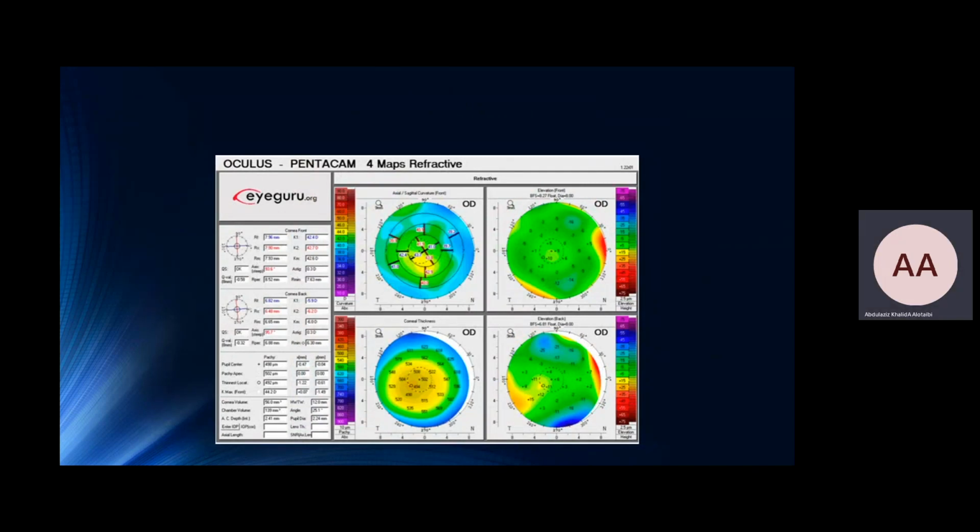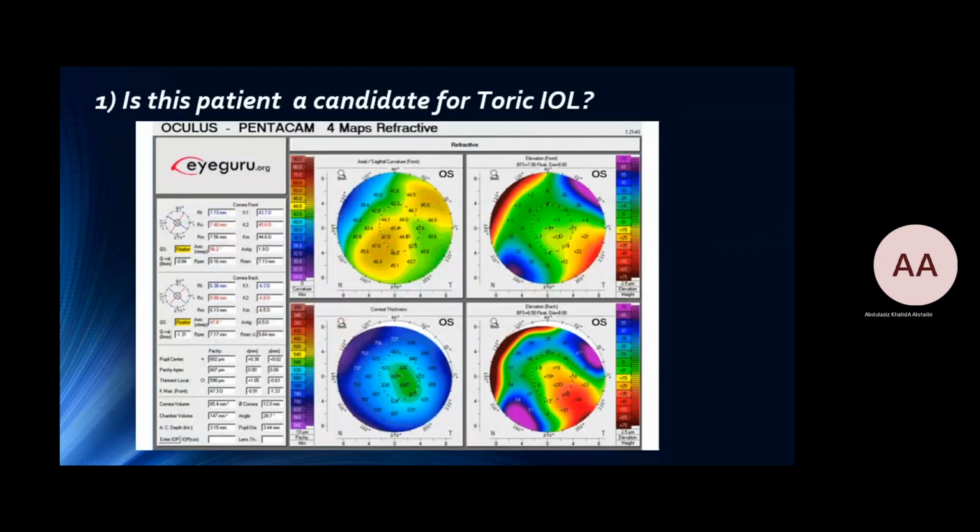Suppose this patient is post corneal refractive surgery. Can you go on? Sure. If you notice the nasal flattening, you have to make sure this patient doesn't have pterygium or any flattening from a lesion. But still, for toric, it's a wide range. Even for irregular astigmatism, sometimes it's asymmetric, but it's oblique. The orthogonality is not usually off. If it's very huge astigmatism, you might still consider a toric IOL. It's not a contraindication, but you need to mention the limitations.